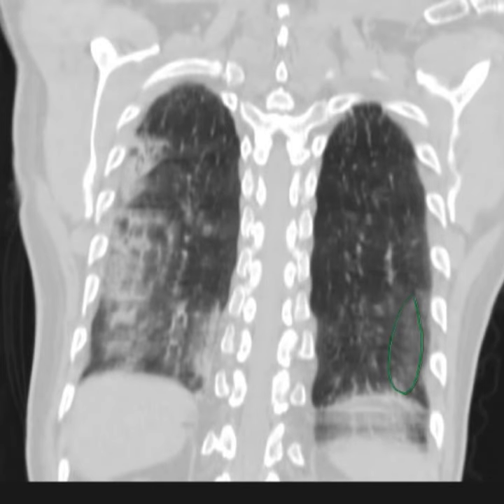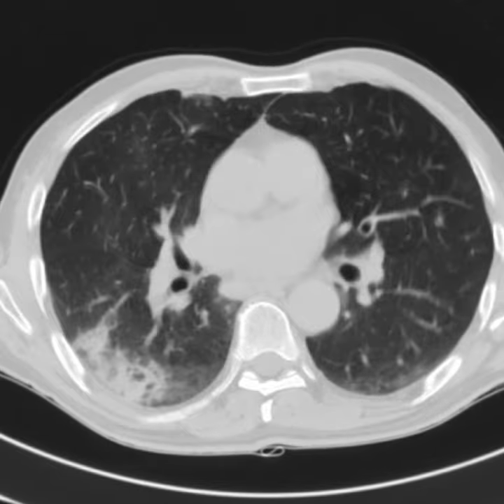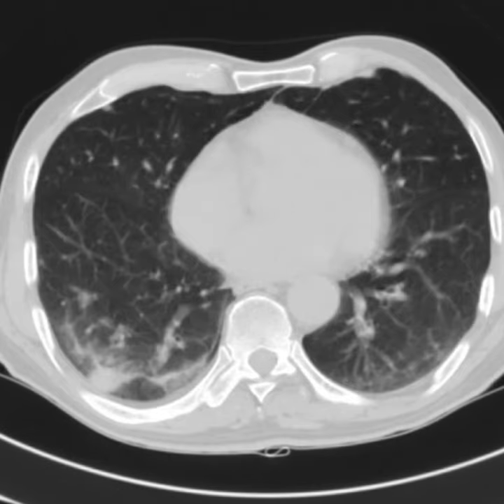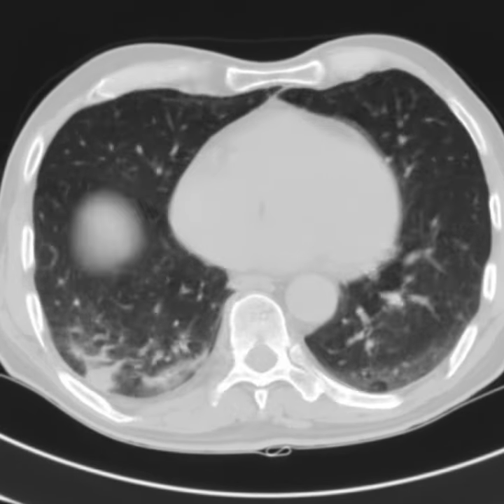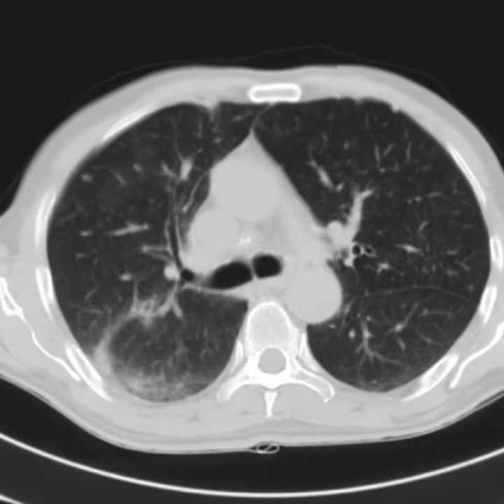And the thing is, if we go back to the axial images, if we look at them carefully, we can see first they are mostly ground glass with probably small parts of consolidated lung, and they are located mainly peripherally and mainly posteriorly. And we can see that the anterior aspect of both lungs is relatively preserved.